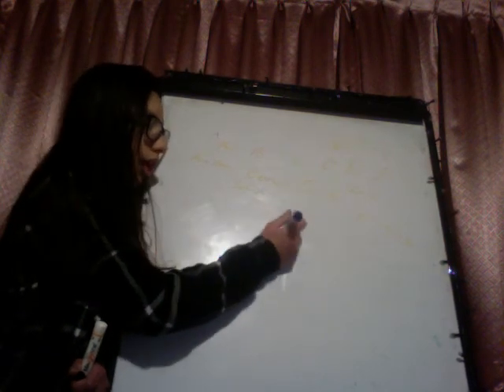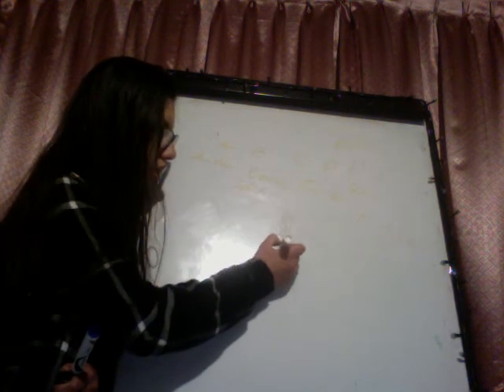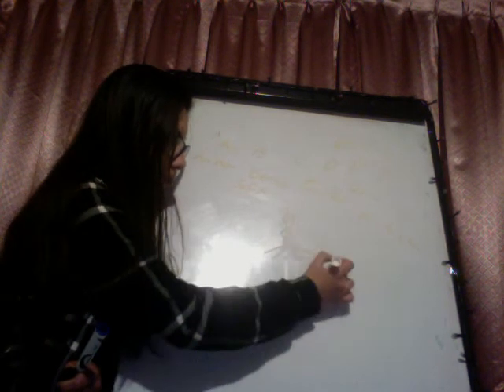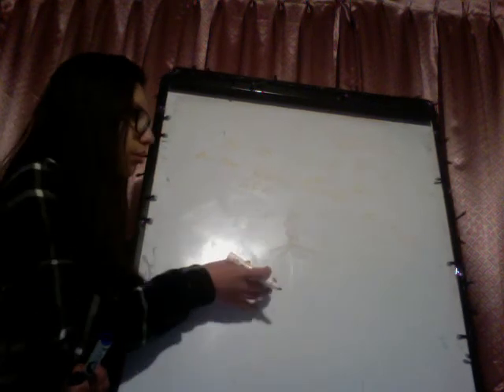The airway should be in the center of the chest X-ray, aligned with the vertebral bodies here, and like this the trachea. The right mainstem bronchus would be a little more vertical than the left, but not too much. I think that I exaggerate, but anyway, this should look like this.